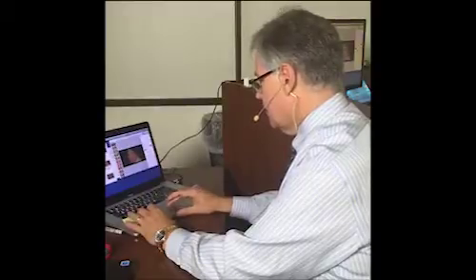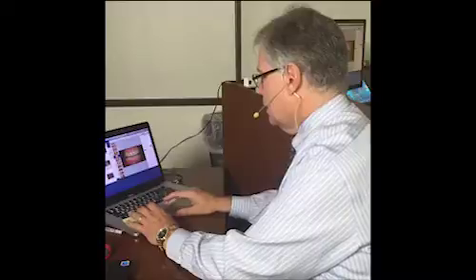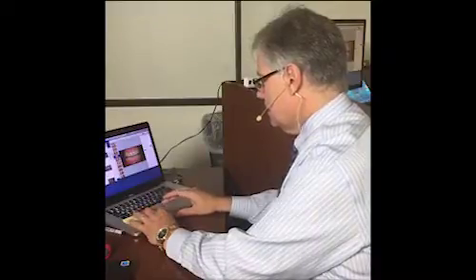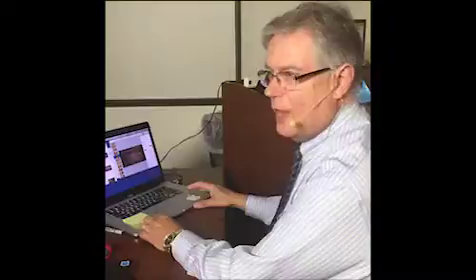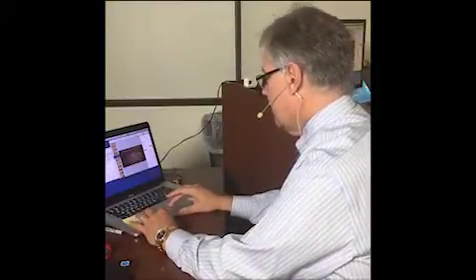I will drag one of his front teeth in there. Let's do this one. All right, for him. I know it's up here. Let's come up to this, and we'll put this in here. All right? Because sometimes I would still want to crop, so I'm going to show you how I would do that in Keynote. Let's close this, because now let's imagine we have them all in there.